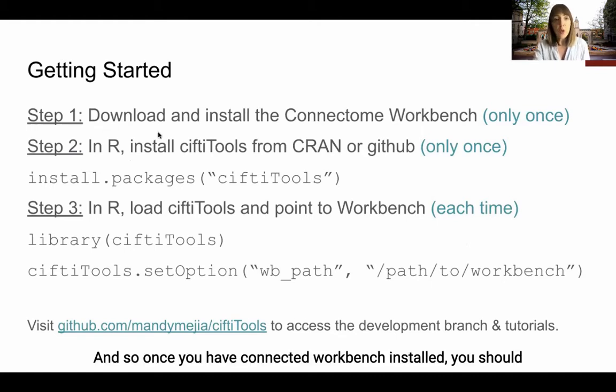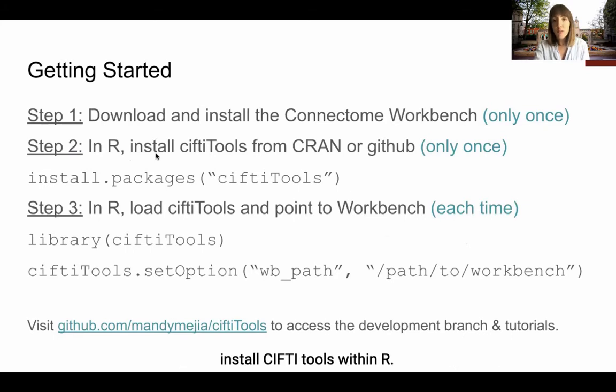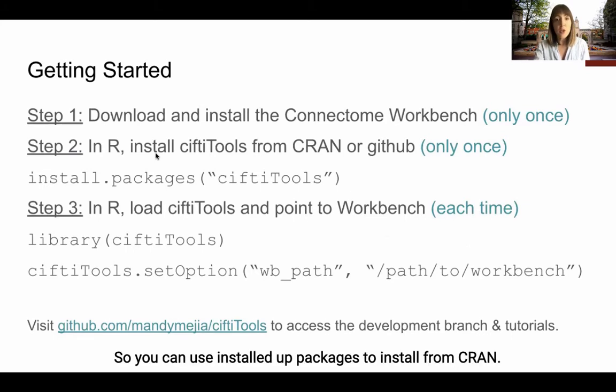And so once you have Connectome workbench installed, you should install CIFTI-Tools within R. So you can use install.packages to install from CRAN, or you can install from GitHub for the latest development version of the package. And then within R, this is the case for every package in R that's not loaded by default. You'll need to load the package each time you want to use it through the library function. And then each time you load the package, you'll need to set the path to your installation of the Connectome workbench. So you do that through the CIFTI-Tools.set option path like so.